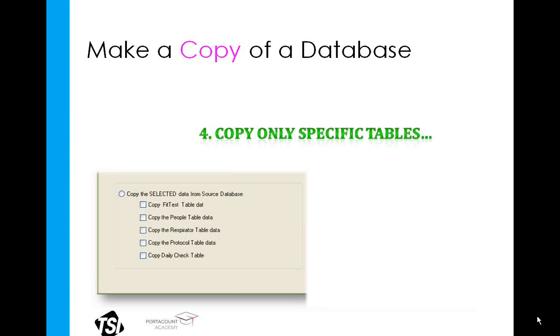In the lower left-hand corner, you can choose to only copy specific tables. Now this comes in handy if you wanted to create a new database at the beginning of 2013, but you didn't need all the fit test information and didn't want to enter all the people and the respirators again. So you could choose the people table and the respirator table alone to be copied. That way all of your fit test information from 2012 remains in the 2012 database, yet all your people and respirators are going to be in the 2013 database with a brand new fit test table ready to go.